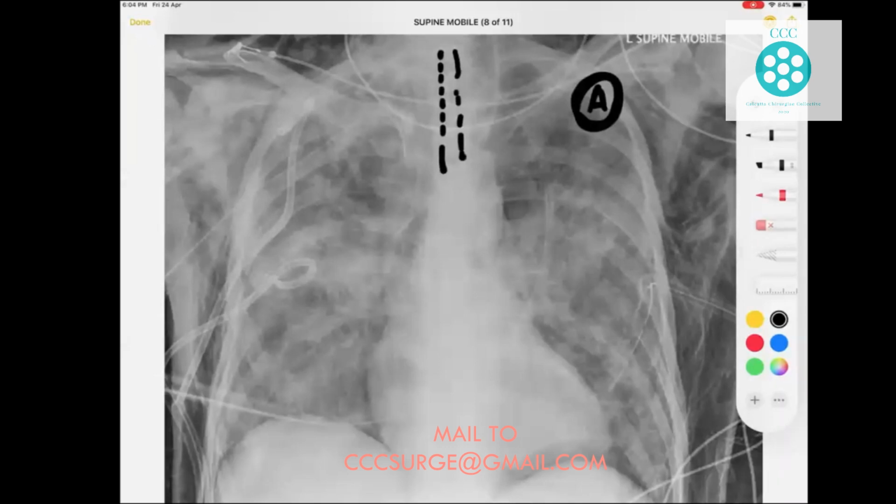The B appears to be bones, and let me see. Yes, there are bones which are fractured. Yes, fracture. At least I can see these three fractures, sir. Maybe there is a fracture on this side, yes, there is a fracture. Yes, there is a fracture. Okay, so B is done, it is a fracture.